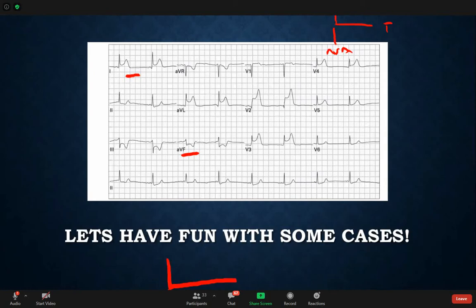I'm in this quarter, right? So now I need to see lead 2. So lead 2 is positive. Wait, let me just draw it somewhere in the middle so it shows.